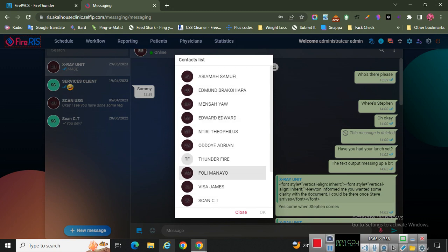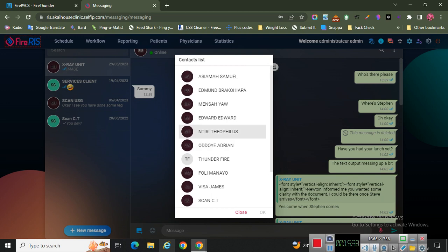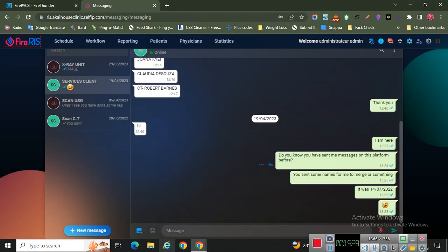But pretty much you can chat with the colleagues or the rooms in here. So if you want to chat with the radiographers, you can. If you want to chat with the clinical services department, you can. And then they can also reply.